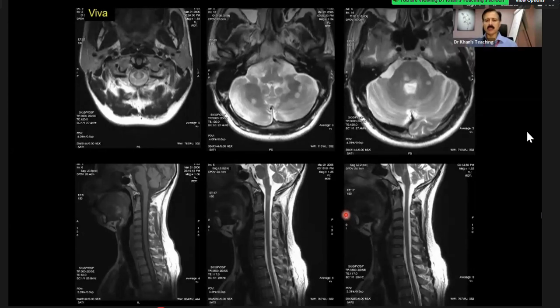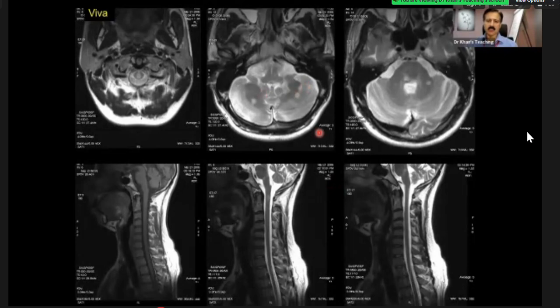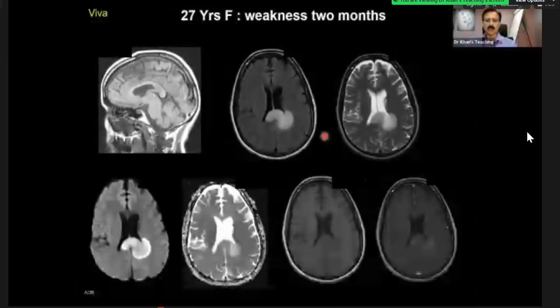Please remember that 10% of patients with MS present with cord lesions, and it is taken as a bad prognostic sign. In the exam, when you see something in the spine, always look at the brain. And if the brain is not provided, you tell the examiner, I want to look at the brain. They want you to say that. In this particular case, there are lesions there. So already we have got 2 out of the 5, right? Dissemination in space. And then you can ask for contrast, and for the rest of the features to diagnose MS.